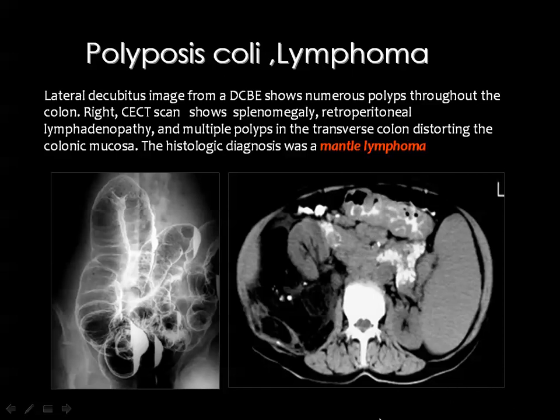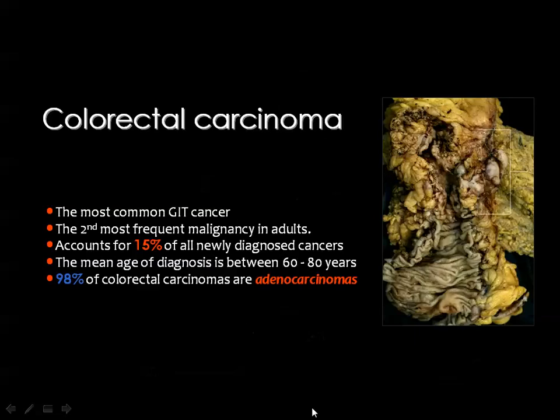And this condition, you may feel that you are dealing with pseudomembranous colitis, but the positive history is important. Look for the huge enlargement of the spleen, which is commonly seen in patients with lymphoma.